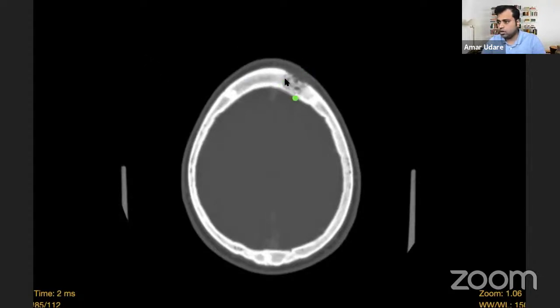This is what a beveled edge is. If there is a surface like this with edges like this, this is what beveling means. So eosinophilic granuloma has these typical beveled edges that have been described. Sometimes we definitely learn the typical appearance, but we don't know what exactly it means. So wherever you come across something you don't understand, make sure that you Google it and understand it so that you have better memory and you basically understand the pathology well. So these are beveled edges of eosinophilic granuloma.